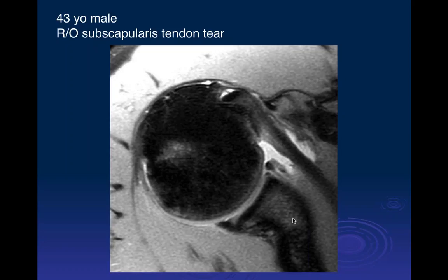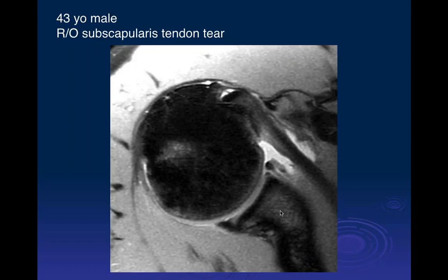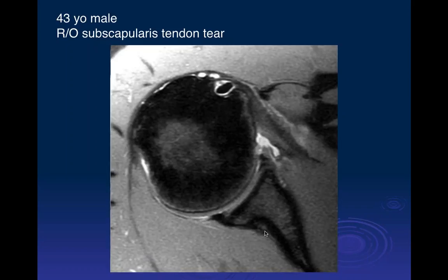Looking at the anterior inferior labrum, I see a fluid or some signal passing through the labrum. It looks okay, you have three structures here. That structure, that structure, and that structure. So is this a tear or what's going on here? Next cut.